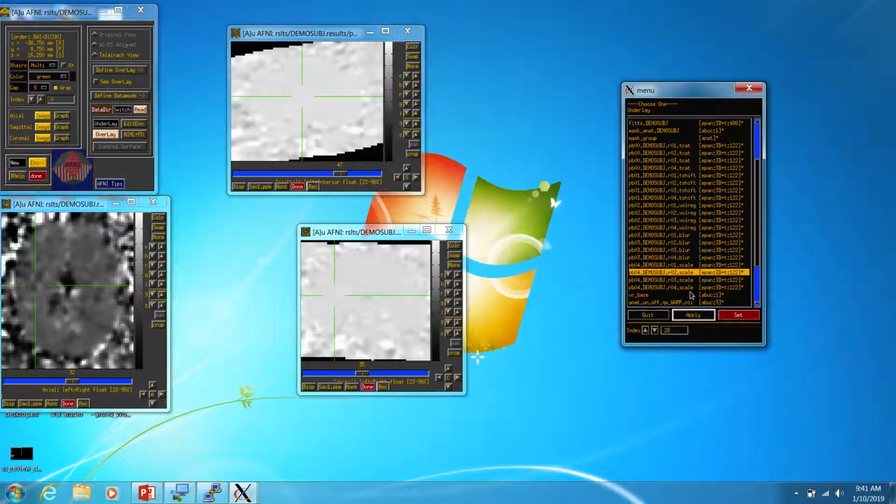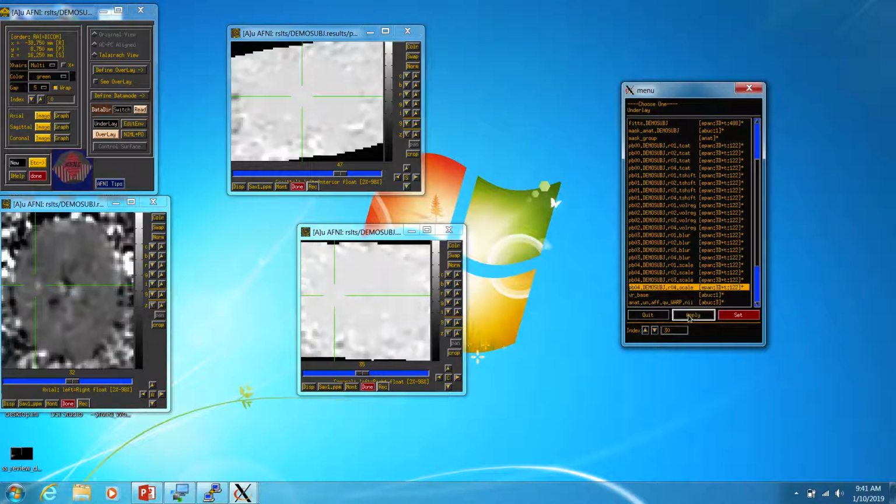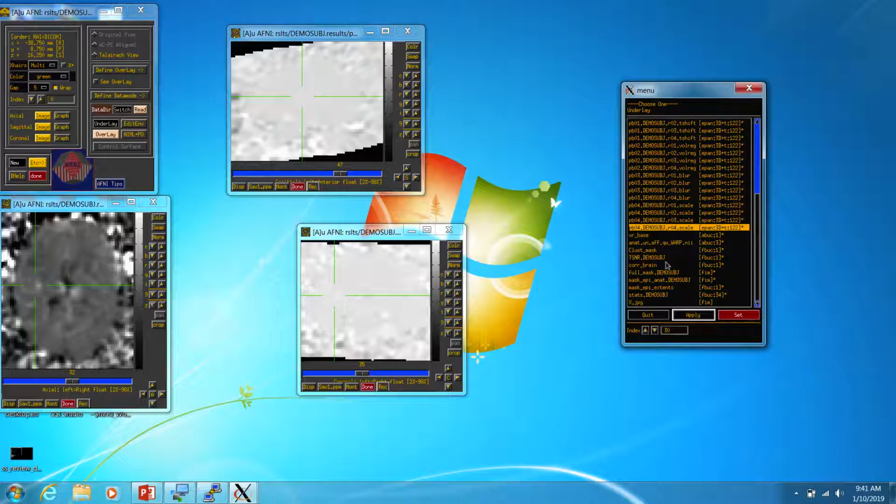So here we'll have another shift. These all ended up looking the same. While it's subtle visually before and everything looks roughly the same, this step actually really equalizes everything. So when we're looking at areas, we'll be looking within the brain, and this keeps all of our runs comparable. So after this point, everything gets merged into one big long run. And it's on this that all of our analyses are run. So I'll show that in a second.